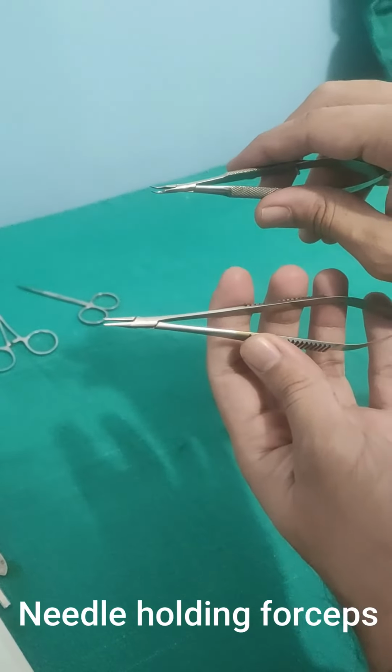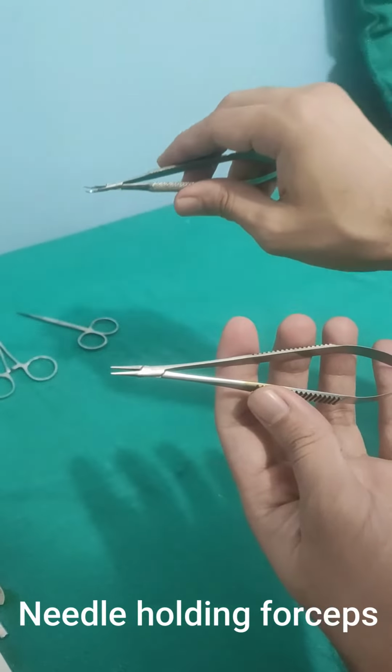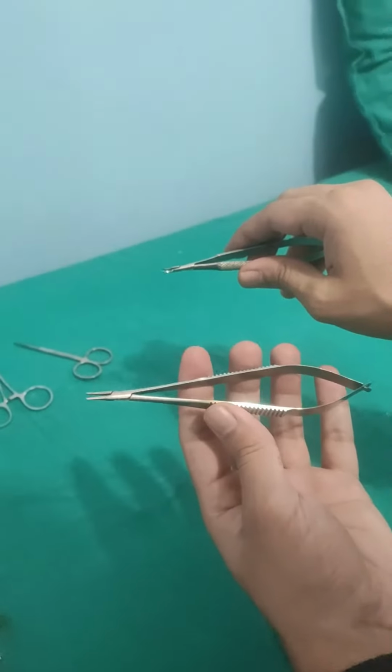As they do not cross each other, these are the forceps, and this one is a small forceps, and this one is a big needle holding forceps.